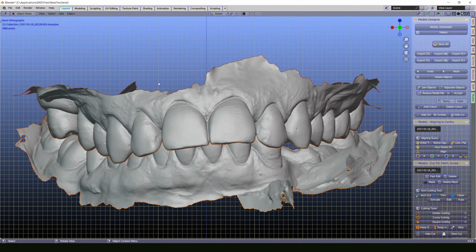So it's an undo function, which is the same as in Word or any other software. So be careful with this one, but if you need to change the position, feel free. I'm telling it from my practice: if you have already many scans positioned, and if you would like the pre-op and situ scans to be in the same position, I would avoid using it and use it only if it's necessary.